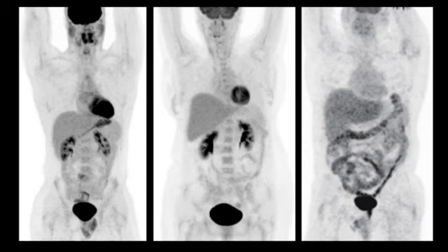There is variable activity within the tonsils, as noted in the left patient, within the myocardium, noted in the left and middle patients, within the stomach, noted in the left patient just below the heart, and within the small intestine and colon, most intense in the right patient. These are all within the range of normal activity.